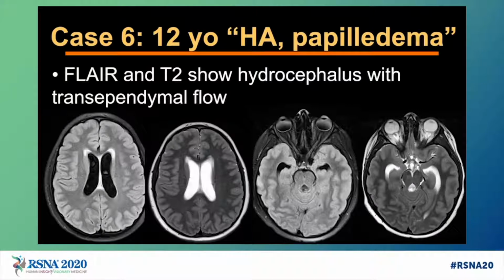Case 6. This was a 12-year-old who came to the ED complaining of headache. The docs did a really good job. On ophthalmologic examination, they diagnosed papilledema. Because of the patient's age, we went to MR to spare the patient the radiation of a CT.